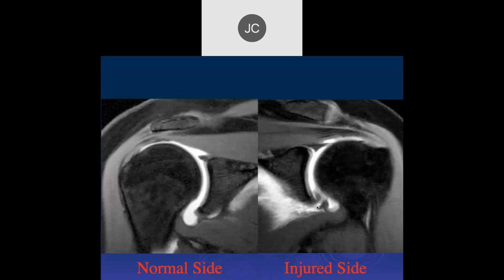This is one of the reasons I really don't like arthrography, because you don't know whether this is just a bad injection, which we see all the time, or whether it's actually a significant soft tissue injury. Especially after trauma, I really don't like doing arthrography. Arthrography is fine if you're dealing with a non-traumatic concern about labral tear in a young athlete, but I really think that you should restrict doing arthrography. In the setting of acute trauma, I really don't like it. It can mask or confuse muscle tears and other significant injuries.